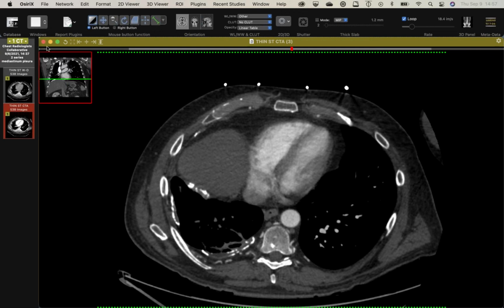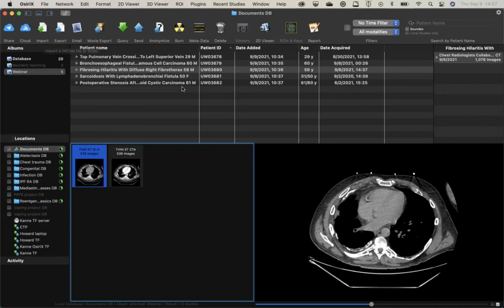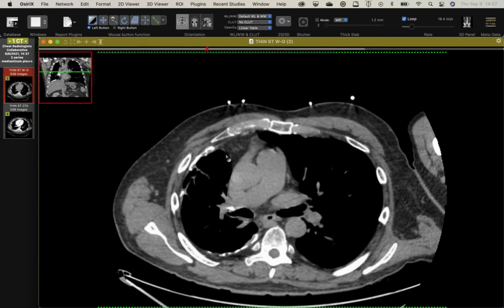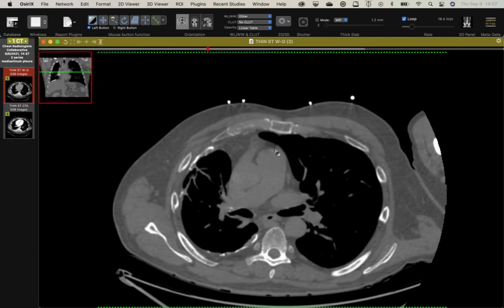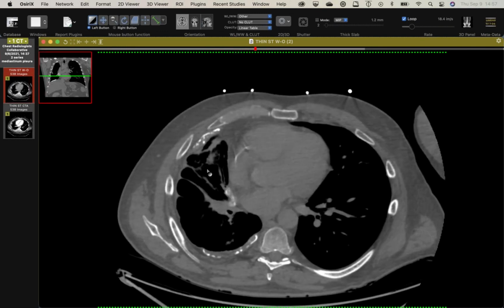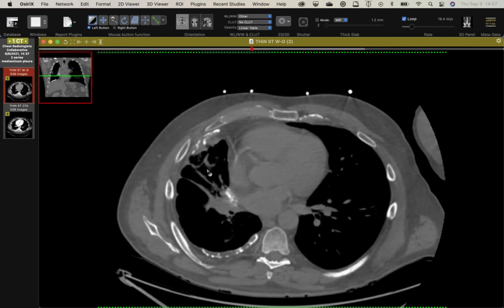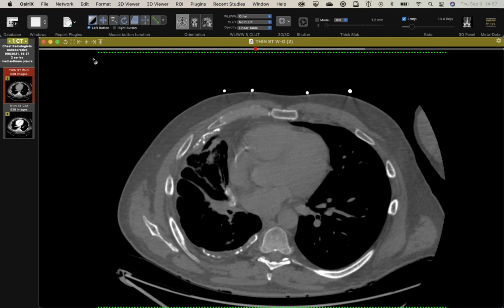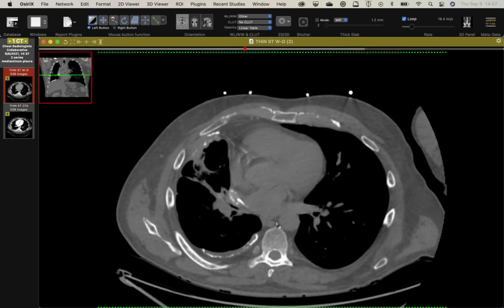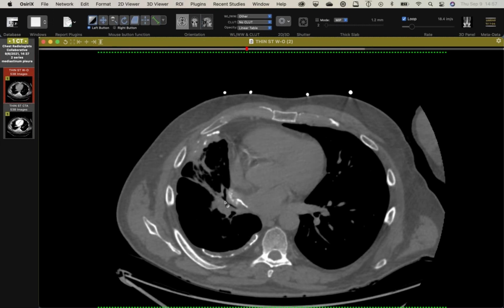So anyway, Jeff, you didn't see any encroachment on the airway that would have predisposed to it? Well, there's some mild narrowing. I'll go to the non-con just because it's a little less artifact. The middle lobe bronchus is a little tight. Like I said, this guy just showed up in the emergency department, so I have no old history, but I suspect he's had an old pneumonia, and whether it's related to this or not is unclear, but he's at least at risk for poor clearance of that lung.